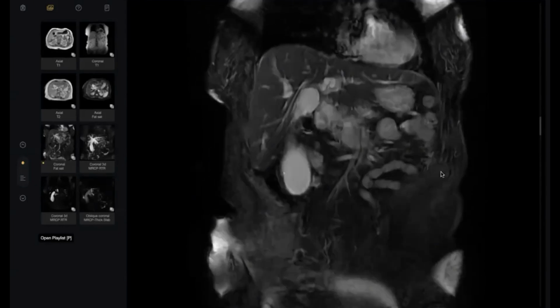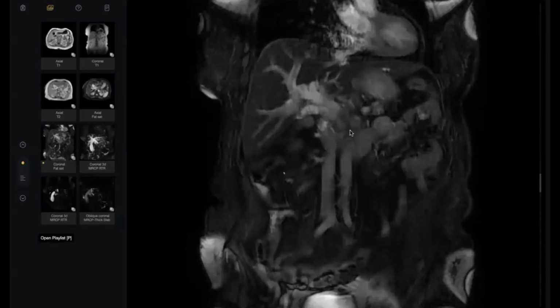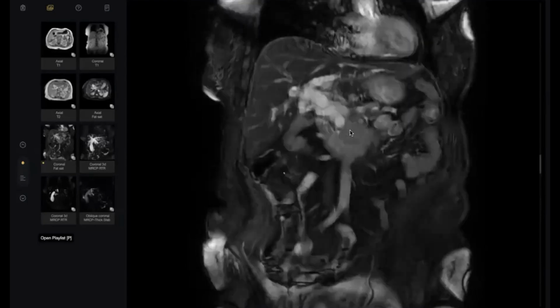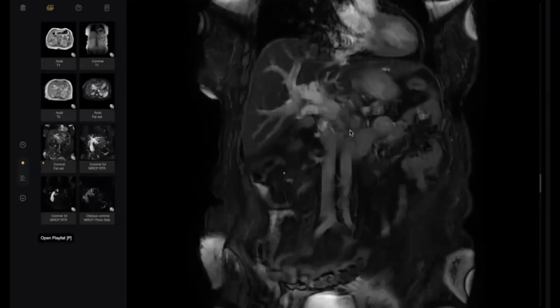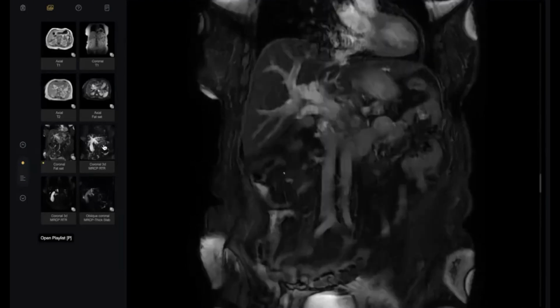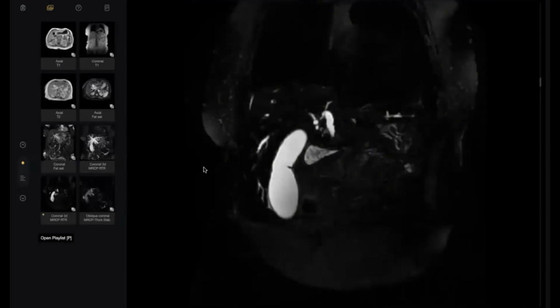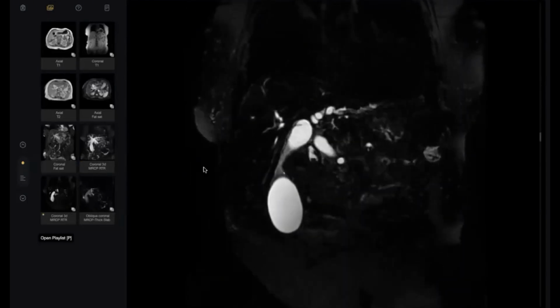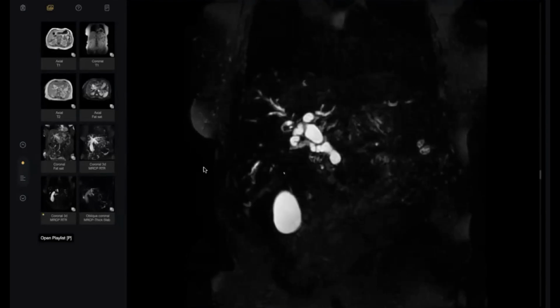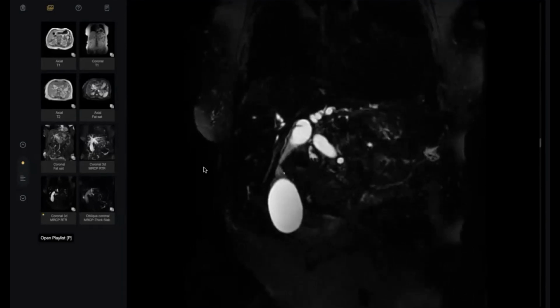Okay, but look here, this part of the head of pancreas, it is very subtle, by the way, very subtle. Okay, so we may include periampullary mass and pancreatic head tumors. So this is marked extra and intrahepatic biliary dilatation. Look here, my colleague, marked, with no stones inside it, no filling defect. But even the pancreatic duct is slightly dilated.